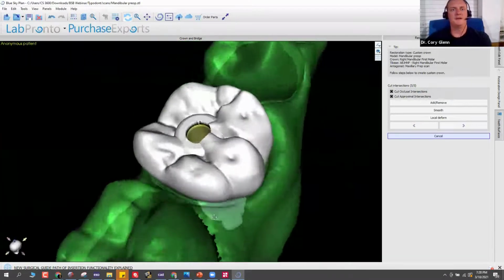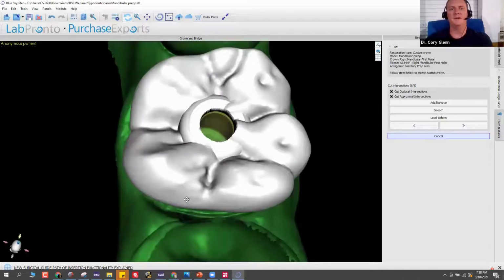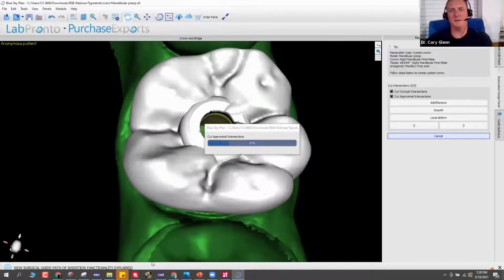And there's our screw retained crown. And you see that I didn't really take the time here to adjust this occlusion and pull it up to how it should be, just because I was just trying to fly through it. But you do see that the software forced a minimal distance around that tie base so that we can maintain that thickness that's required. So last step would be to cut the intersections. We'll finalize that, and that would be your tie base crown.